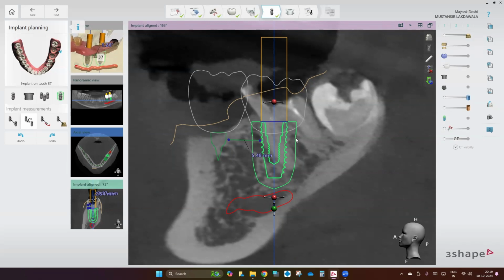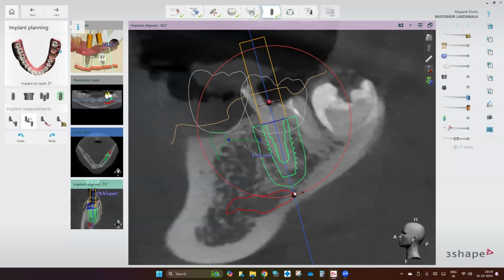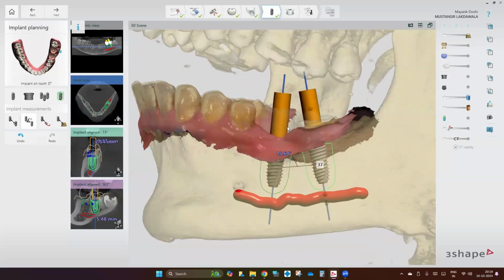then honestly speaking, there is no point fighting. You might as well show them what the repercussions are. Like, for example, if I have to actually plan it slightly to manage or complement something like this, slightly, not too much, this is the implication that it is going to have when you are managing the prosthetic part. This is what we have to show the dentist.